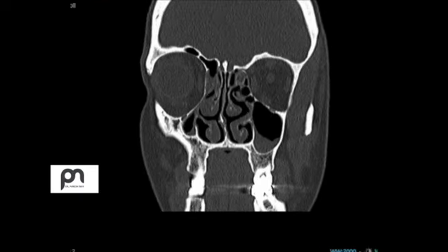For junior surgeons, I would like to add this point. Whenever you start seeing any scan, I'll give you a small tip. Even if you don't know any details about the scan, just have a look at the other side and compare the symmetry. Almost always you will notice that there is something unusual. Like in this case, you see, this is unusual.